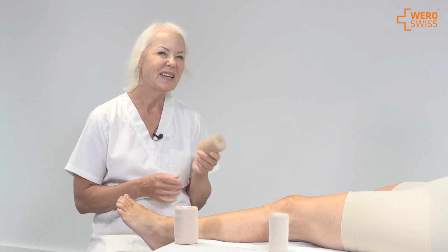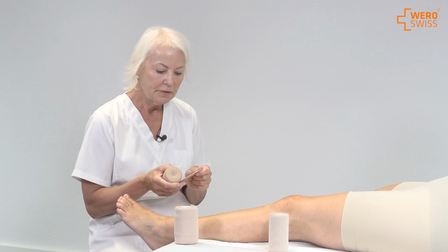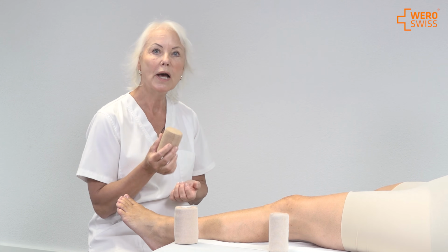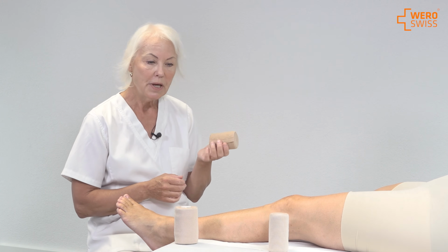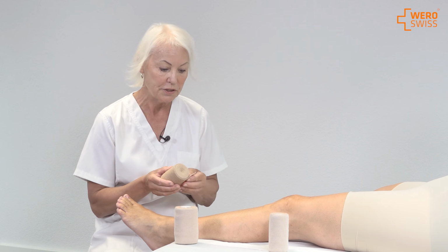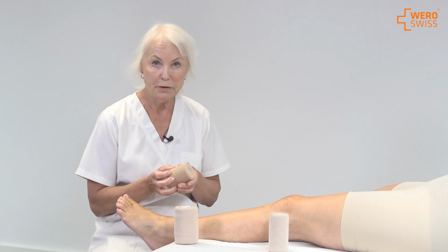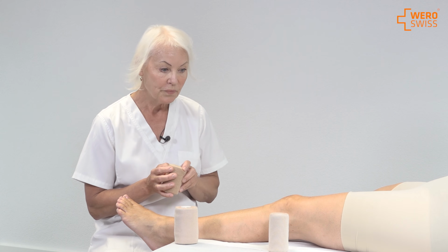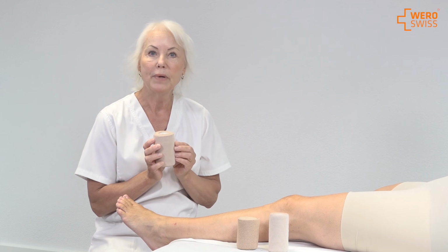When you have the high elastic bandage, it has a very high resting pressure. This means that during nighttime, when the blood circulation is resting, it's too high to use, and therefore you don't use it. You use it in the daytime, and it's perfect for all the orthopedic problems that you have with the patient. And if you have a patient in a wheelchair or staying in bed, this material, high elastic, is what you should use. The third one that we have on the market is the cohesive bandage.